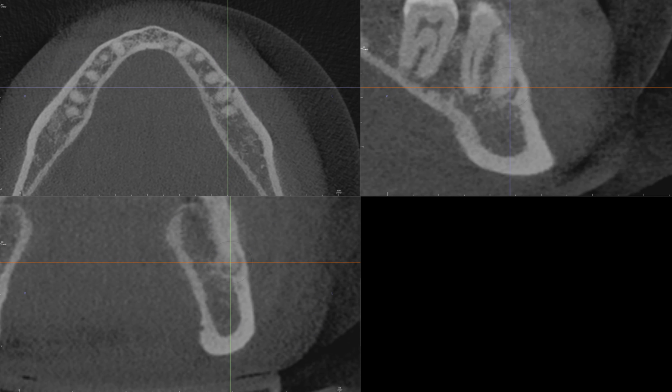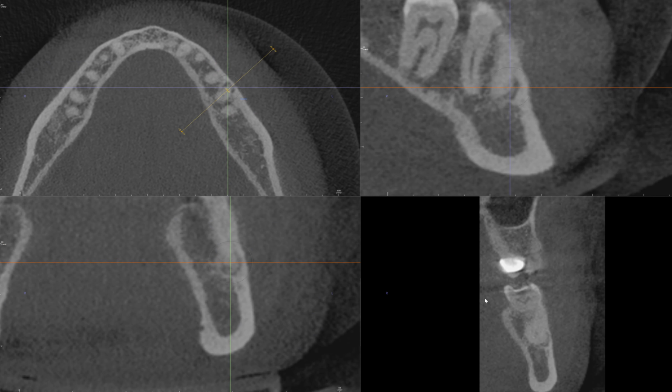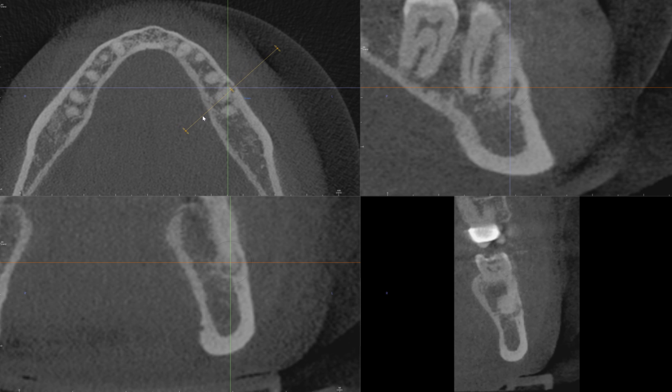Also make a custom section. Okay, let's start with the custom section. And as I scroll in the AP direction, how do you think it changed over the year and a half? What are the changes that you see?